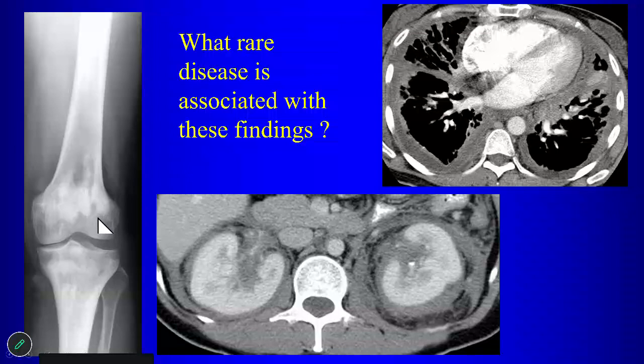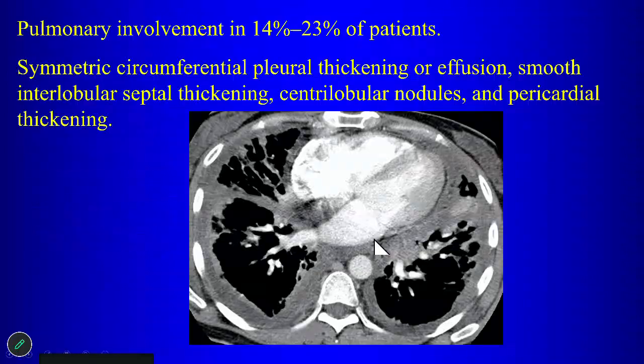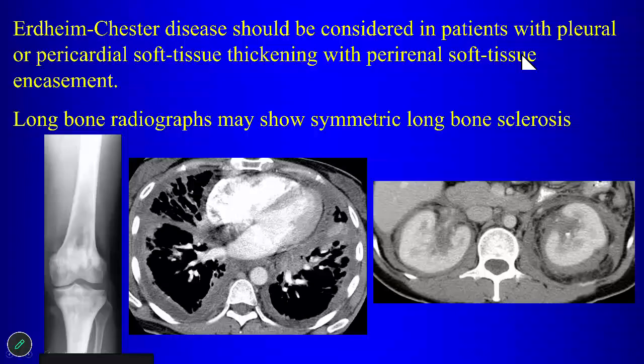Okay? Bone disease with lesions in the long bones, and this very funny looking infiltrative appearance around the kidneys. So this is like, no, it's not lymphoma. This is Erdheim-Chester. I'll let you read about that in the handout, but if you come across that on the board exam, this perinephric thickening is very characteristic of Erdheim-Chester, but you also get long bone lesions with that. Okay.